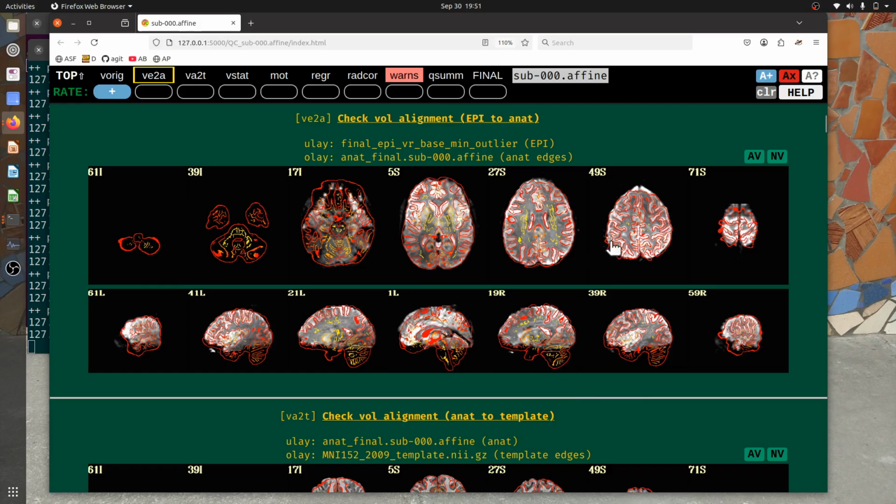So this is something I would look at. Again, if my study depended on these regions, I'm in trouble, but this data itself looks pretty standardly reasonable. The geometric distortion, there's a little bit I can see, but it's not what I would consider hugely problematic for most EPI data, so I'm willing to say that that's pretty reasonable.